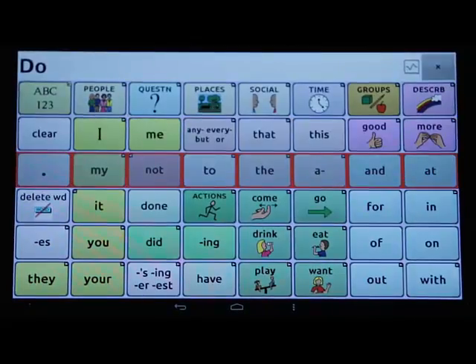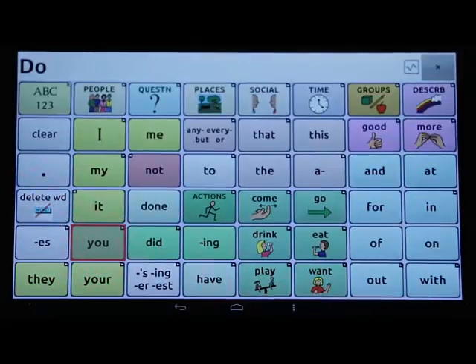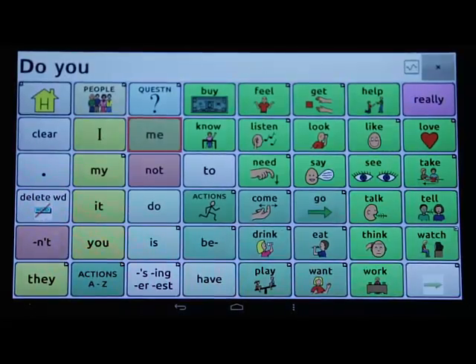This might be a nice option with Word Power because it's such a colorful vocabulary. You can also adjust the degree or percentage opacity as well as the color of the overlay. I will go with the defaults.